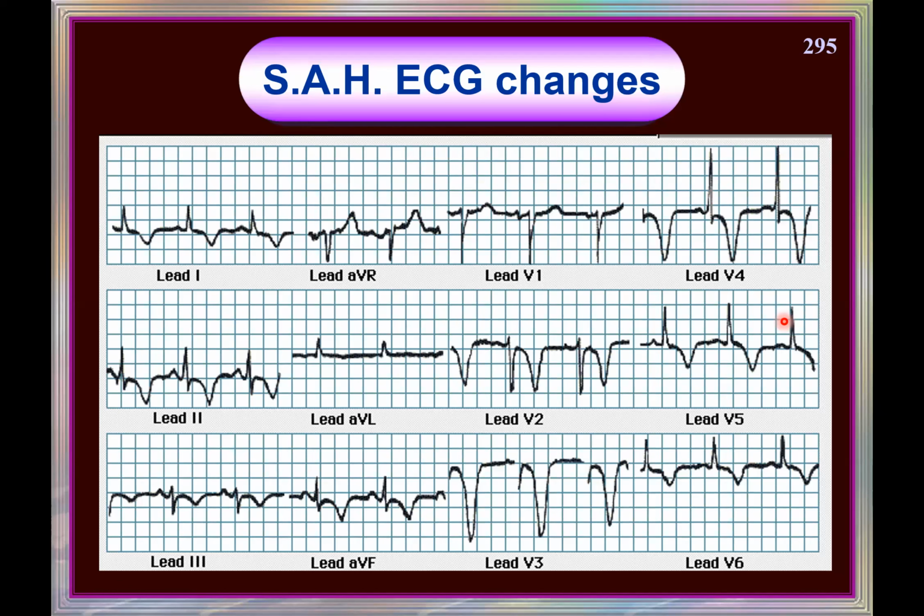Subarachnoid hemorrhage. Okay, this is an exercise for you. Find out and tell me why there are ECG changes in subarachnoid hemorrhage. The why of it I am not telling you, but the what of it I am telling.